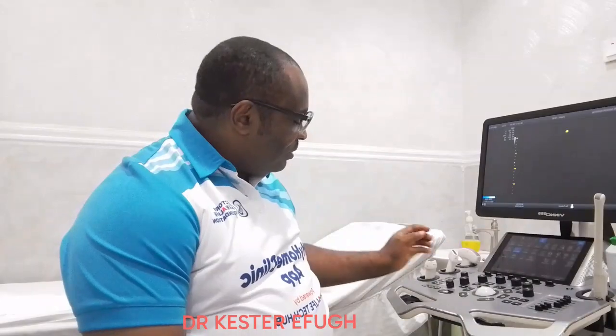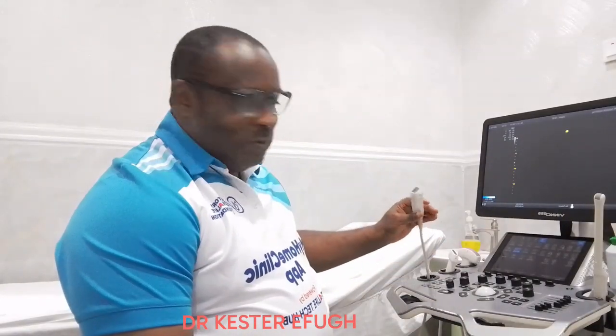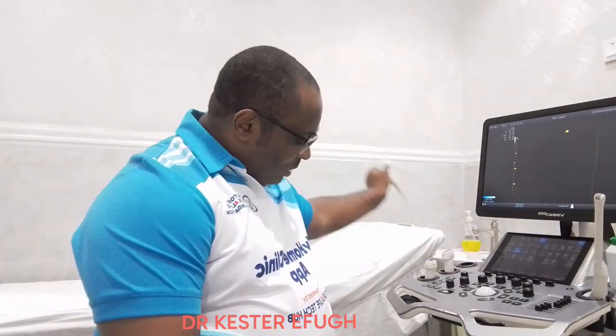In today's video, we will talk about ultrasound probes. I had earlier introduced you to the ultrasound machine, so today we'll talk about ultrasound probes. We have some of them here. So what are ultrasound probes?